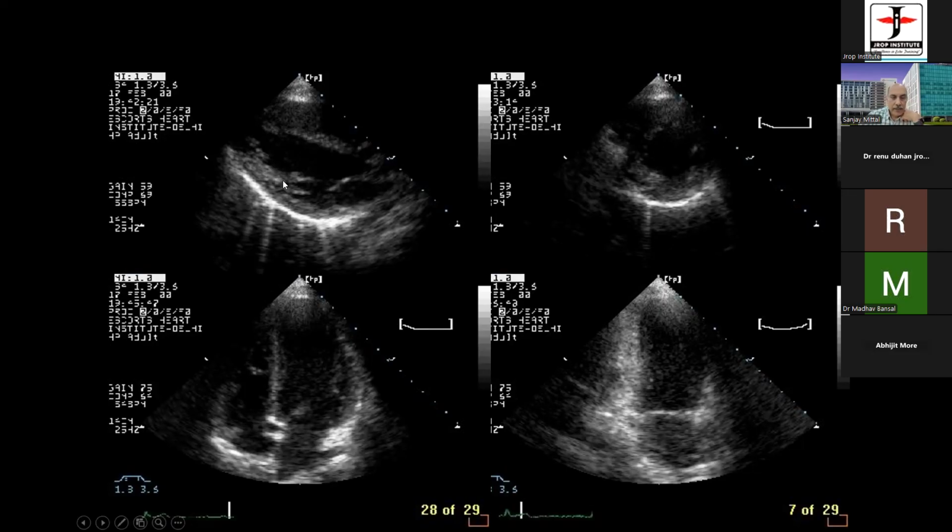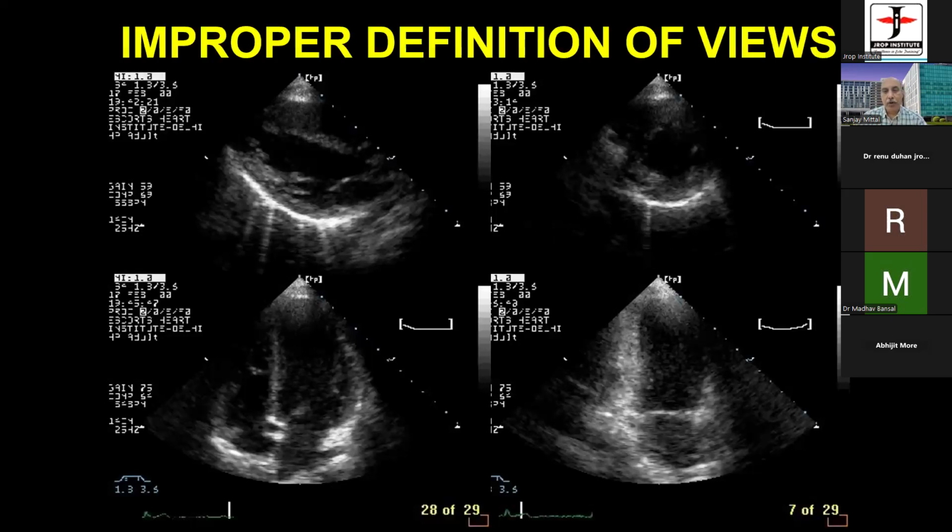Similarly, as I very clearly mentioned, parasternal long axis view gives rise to the posterior wall, not the inferior wall, and papillary muscle origin is from the inferior wall, not the posterior wall. So these kinds of distortions do happen during diastole and systole, and we have to be very cautious what segments we are assessing in diastole and systole. Otherwise, we keep on making mistakes and wrong interpretations.